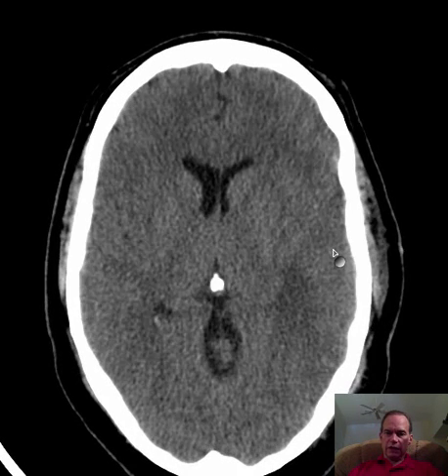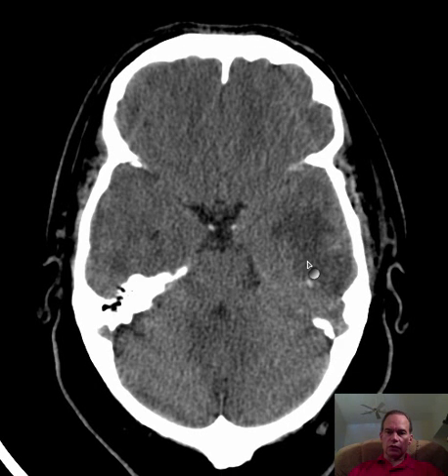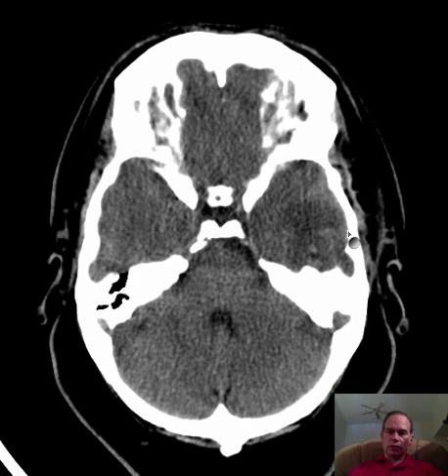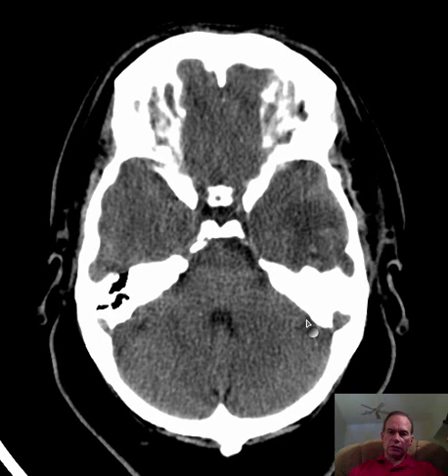And then we get above that level here. So this is below the level of the Sylvian fissure in the temporal lobe. It's a temporal lobe because it's inferior to the Sylvian fissure. It's in the region of the left temporal bone. This is the temporal squamosa. And the petrous portion of the temporal bone is this tent-like structure here, which we see on both sides.